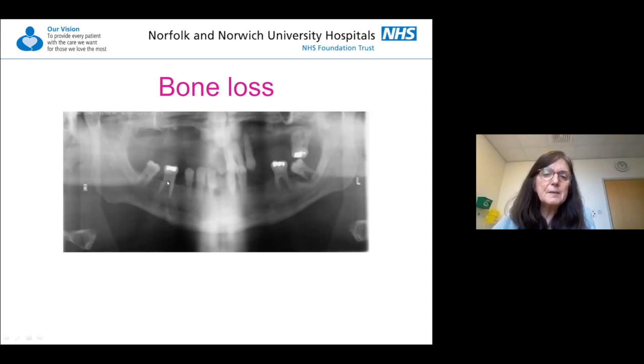And you can see areas here where the split between the two roots, the bone doesn't even cover that. So again, a site where infections can occur. We sometimes worry about patterns of bone loss, but when there is this generalized pattern, this will reflect chronic periodontal disease.